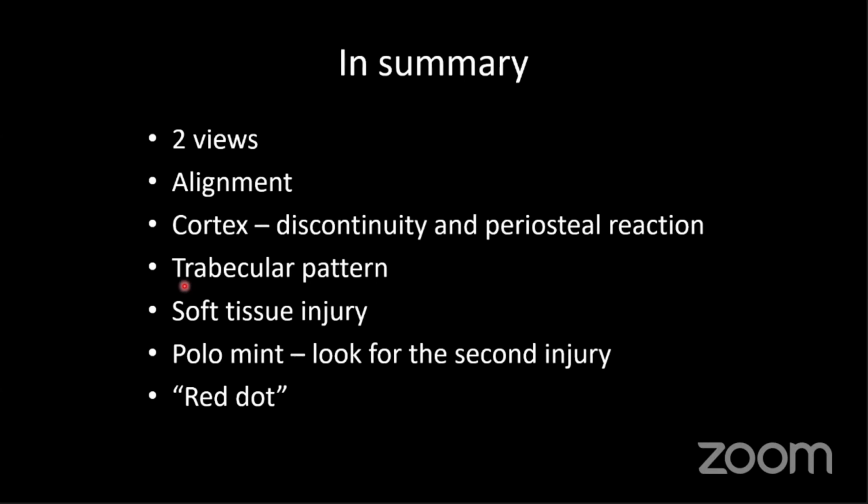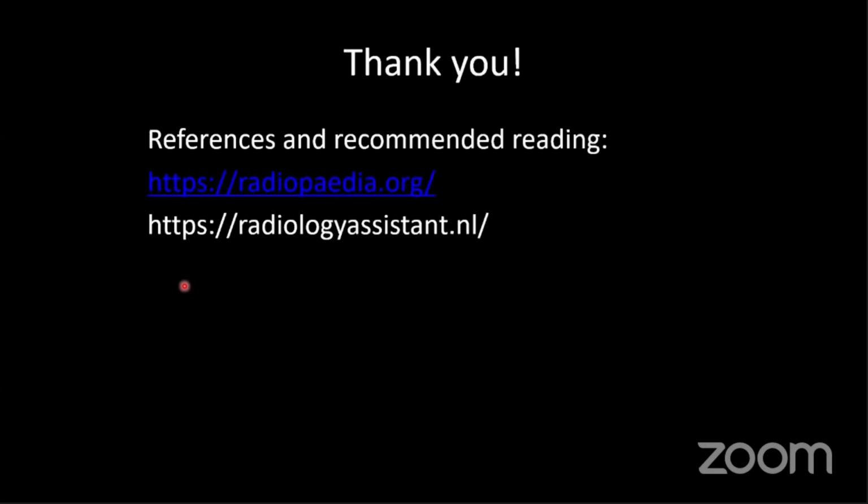And I didn't realize that a lot of you are radiographers, but for those of you who aren't, if the radiographers say red dot on the film and you don't know what the abnormality is, you should look closer, because there's most likely an abnormality there. So that's everything I wanted to talk about.